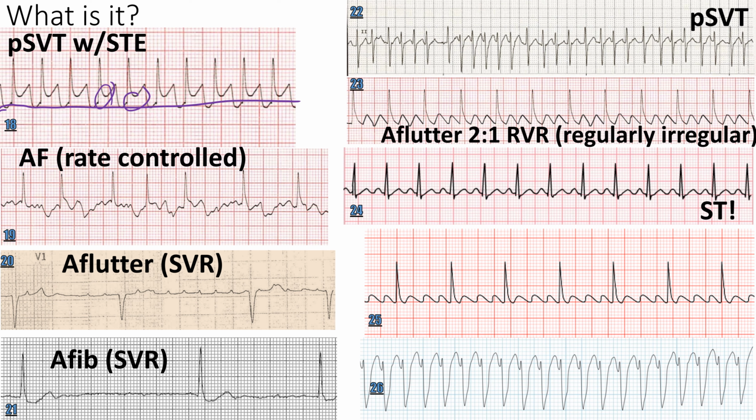Is 22 regular? Regular? Yeah, I would say that's more AFib than anything. Yeah, let's change that. Because maybe you can say a little run right there. But let's just put that AFib. AFib RVR. All right, and then next one, 25.